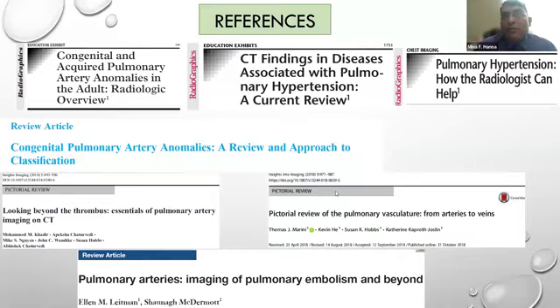Maybe if I am lucky to see hyperdense filling defect or hyperdensity along the vessels and say it could be pulmonary embolus, but again it will be suspicion, I can't build my treatment on it. For PE I need to give anticoagulation, so I can't build my treatment on suspicion.